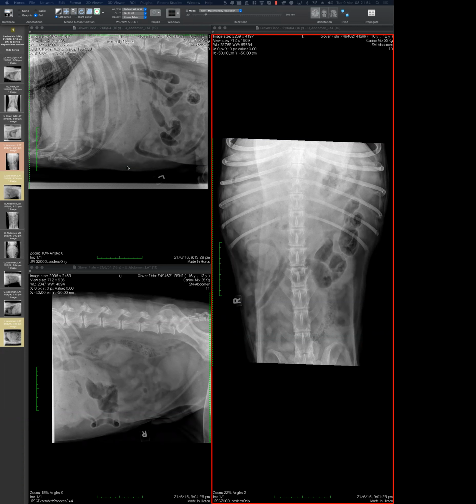I think it's definitely displaced by the mass in terms of where it's located, but the appearance, I still don't see how the mass can explain the bunching appearance or the fact that it's full of gas. Yeah, I'm still concerned about those two parts of it.